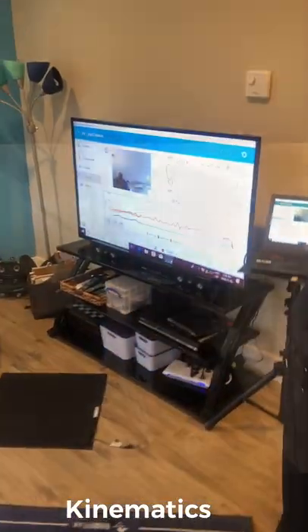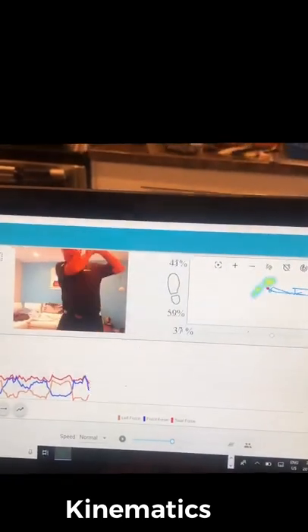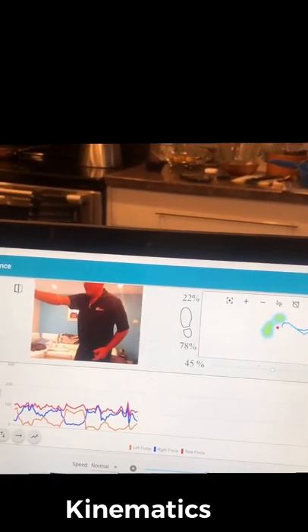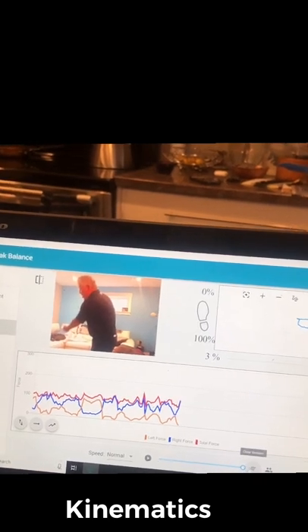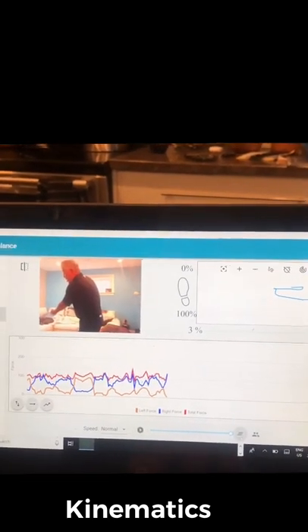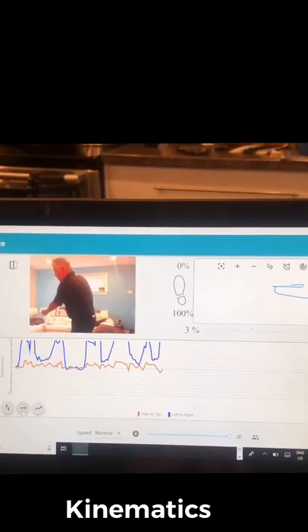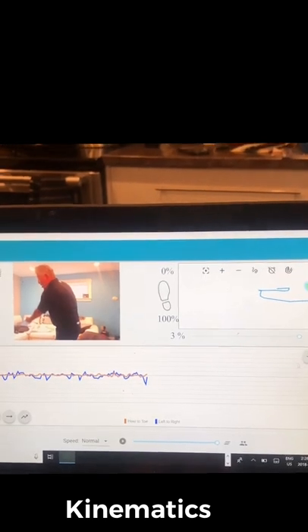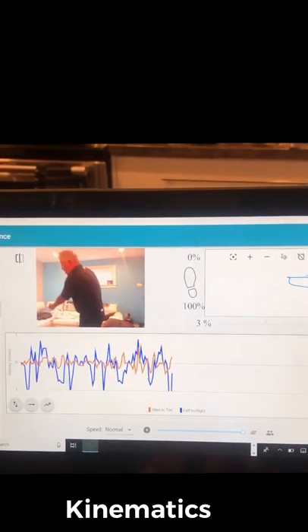Let's take a look at all 3 swings captured with one 10-second period. There's a simulated golf swing. There's a tennis serve coming up. And there's a slap shot coming up. All with the center of pressure trace, all with the velocity chart, all with, if you want to change the chart to be distance over X, if you want to change it to break the center of pressure into its 2 components, and you can scale it by going up or down, larger or smaller.